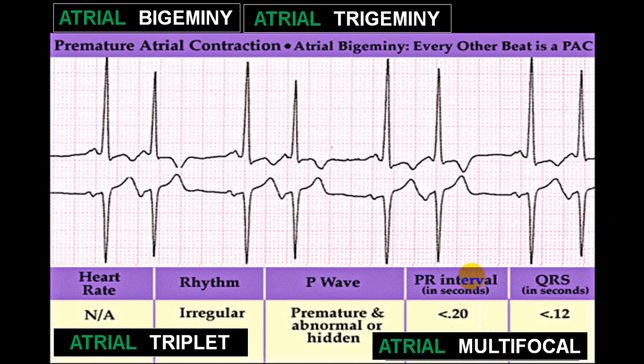These are the terminology. But if you come across a different focus, the P wave is different each time. Now you can see here the P wave is different. This is a P wave. See this P wave. See this P wave. So if these P waves are different, then we'll call that a multifocal. But if they are the same, this looks nearly the same. If you see this, these are nearly the same. So this is unifocal.